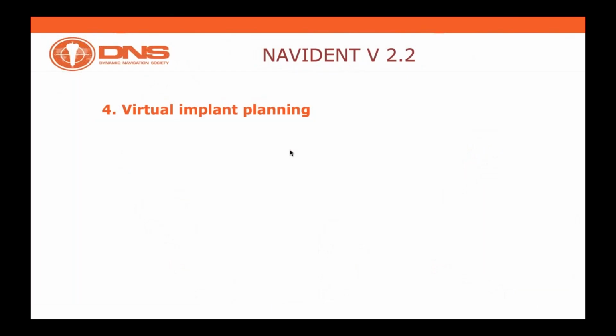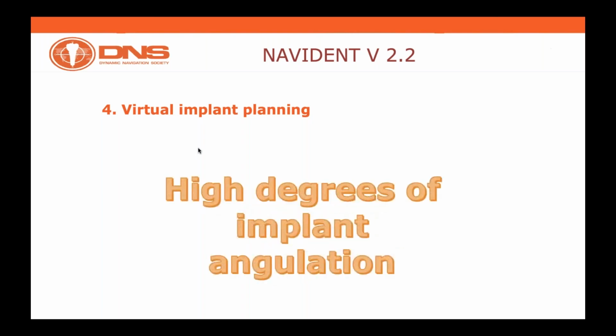So that ends up the features on implant planning, and I feel that it's going to be very helpful for you guys using and the ability of doing.